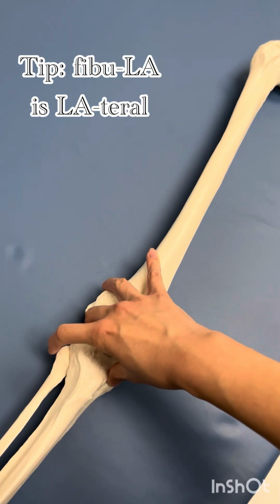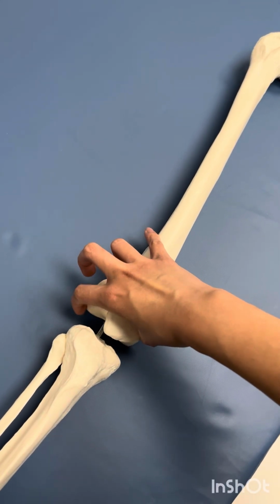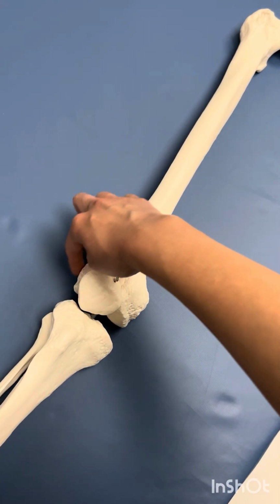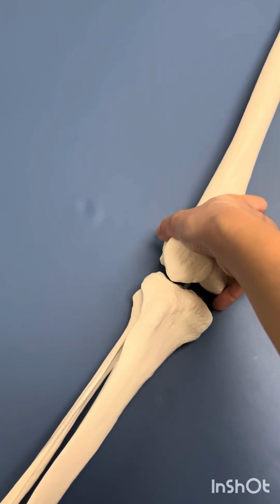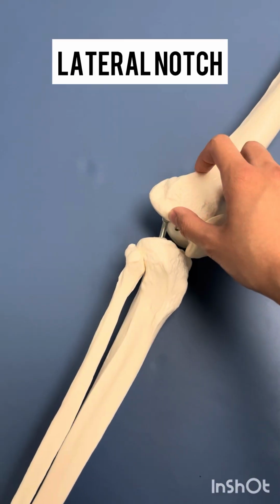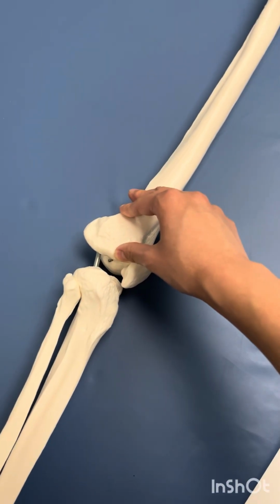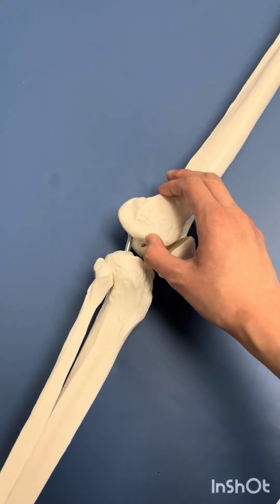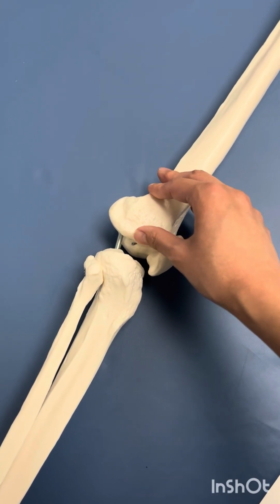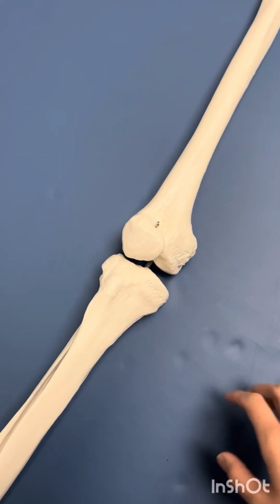The fibula will be on the lateral side. The lateral condyle will be right here. The lateral epicondyle will be this rough area above it. The lateral condyle has a little notch right here. The lateral notch is really important. This is what radiologists are looking at, because if you have a really deep lateral notch right here, it can mean that you have a torn ACL. I will show you kind of what it looks like.